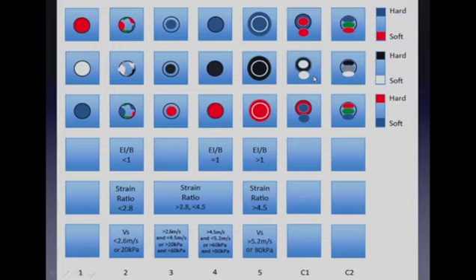And another thing that we haven't talked about, but I believe I've given a Sono World lecture on this, is there's a cyst artifact that we find extremely useful. In our practice, we've been able to eliminate a lot of biopsies based on this artifact. And this artifact can be the bullseye artifact, which I show here, where we have the white dot in the black background with the white distal spot. Or on some manufacturers it shows up as this blue, green, red, or BGR signal. And I kind of gave that as a cyst 1 and a cyst 2. And again, that just varies based on the manufacturer. But this is a very useful sign in determining something is cystic with very high sensitivity and specificity.